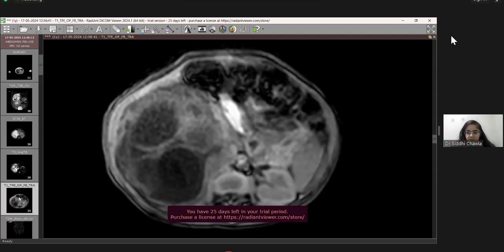So coming back, can you please show a glance of case 1 and 2? I think I have them. So what did we have in the first case? In the first case, we have this lesion in the mediastinum in the right upper zone and mid zone with well-defined margins and ill-defined margins with the midline.